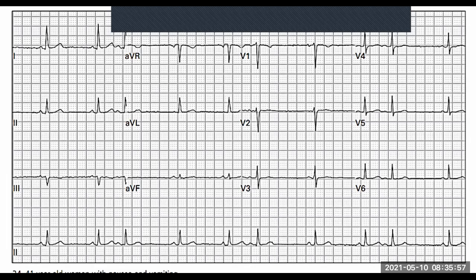Okay, all right. Then let's look at does a QRS follow every P? So in other words, is the ventricle contracting after the atrium every single time? So let's have a look, all right? So let's look at our P wave. Is there a P wave and a QRS? Yes. Is there a P wave and a QRS? Yes. P wave and a QRS? Yes. P wave and a QRS? Yes. The reason why I'm doing each one is because we have to make sure. P, QRS, P, QRS, P, QRS, P, QRS, P, QRS.